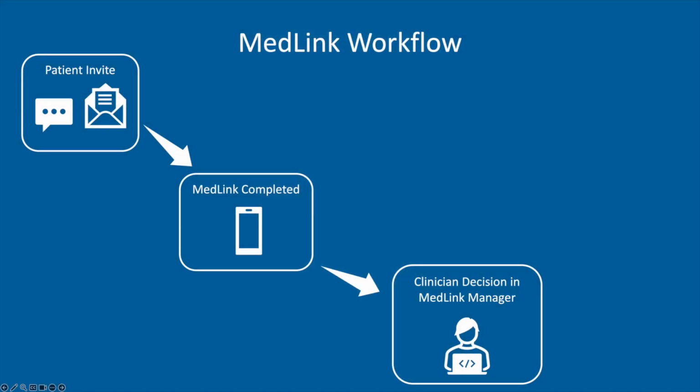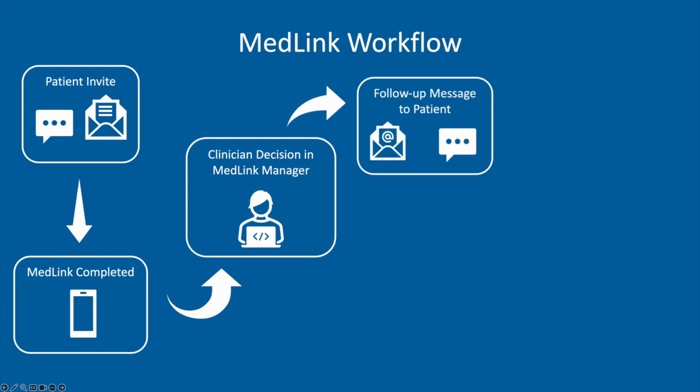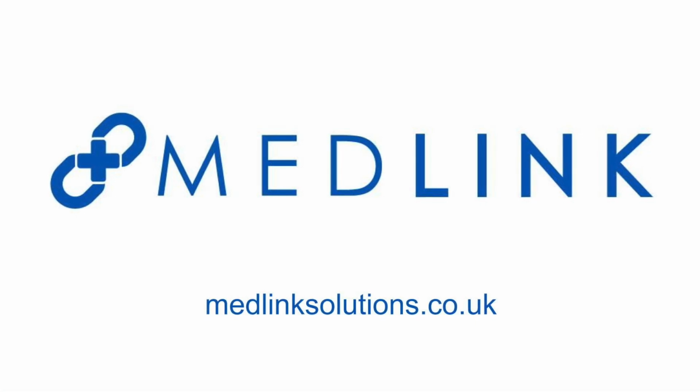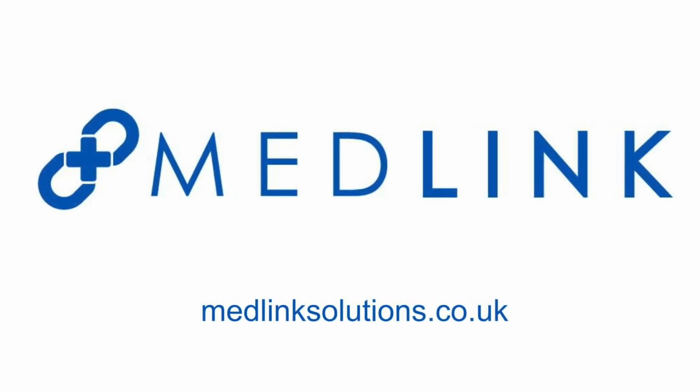In summary, the MedLink data supplied by the patient is presented for clinician decision making within the MedLink Manager. Once those decisions are made, follow-up messaging and automated appointment booking is available, and critically, all of the patient data, plus a record of the decisions made, is automatically entered into the patient record. We trust that this new functionality will help make MedLink even more beneficial for your practice recall and review process.